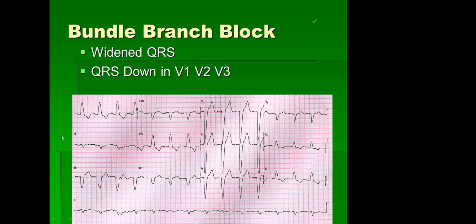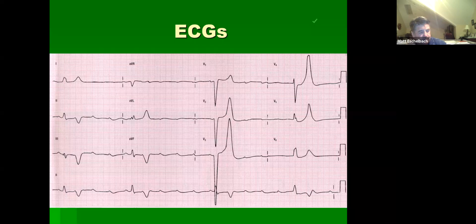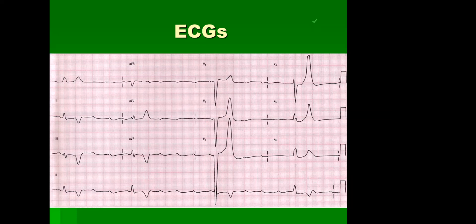Okay. All right, Keith, you're up. Right off the bat, the spoon. Let's see. So looking at, I'm going to start from the beginning. Looking at lead 1, can't tell if there's a P wave there, but you can see it in AVL as well as V5, V6. V5, V6 does have a depression.